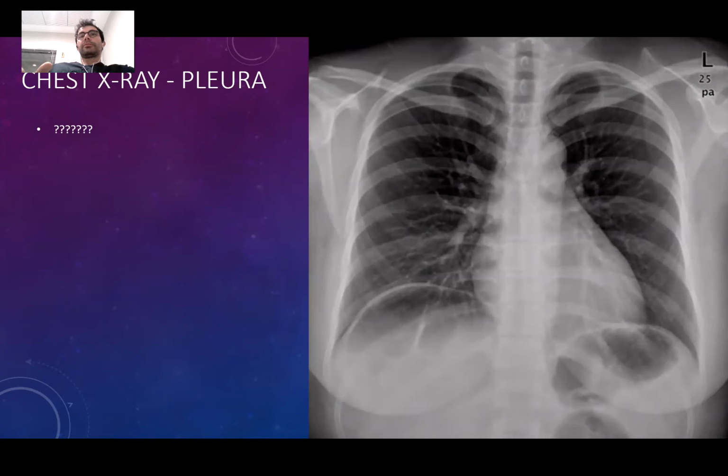Does anybody see anything abnormal? I'm seeing something. Professor, I think there's free air at the bottom right. Some air under the diaphragm.